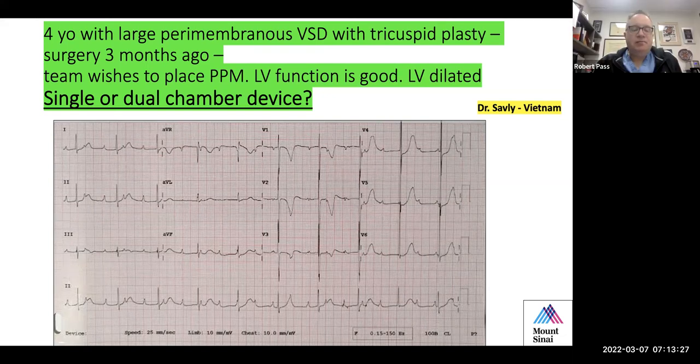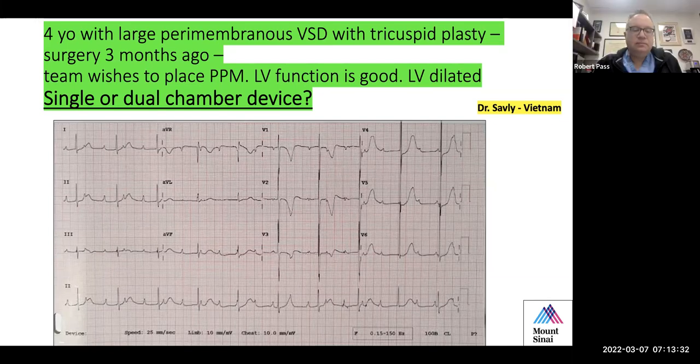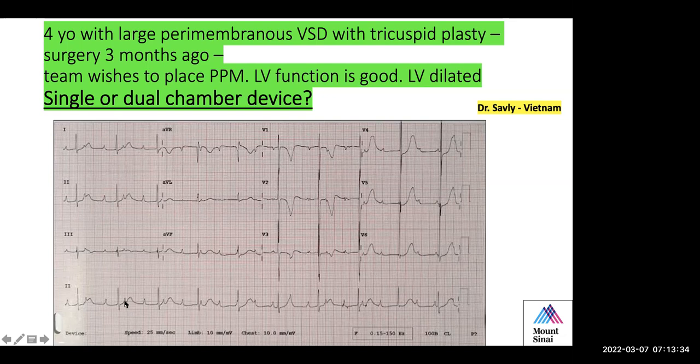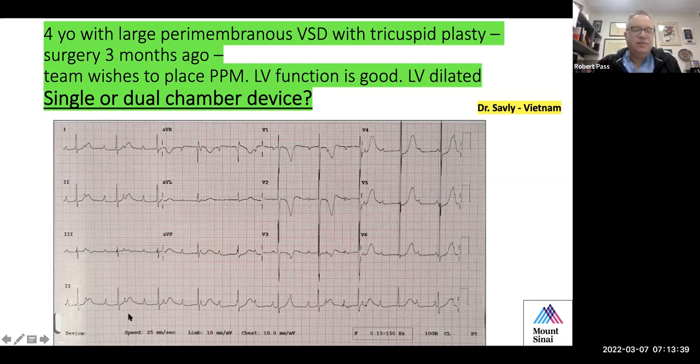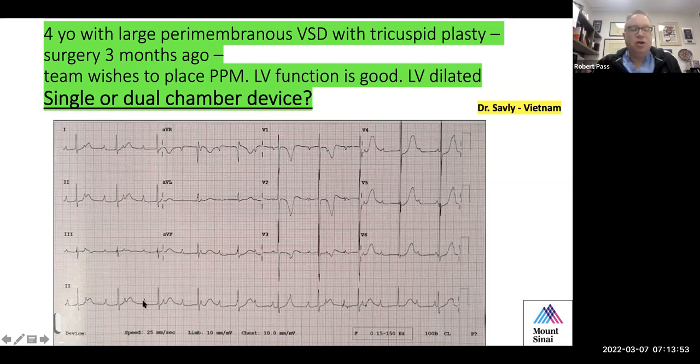Yeah, there are P waves, like on the long strip, the second QRS, it seems that there is a P wave between the T and the QRS. And one of the things you always want to look at is is there a consistent relationship of the P waves to the QRS? No, there is not, right? Here it looks like we have a long PR of almost 400 milliseconds, then we leave it longer, and then here it's short. It's like all over the place.